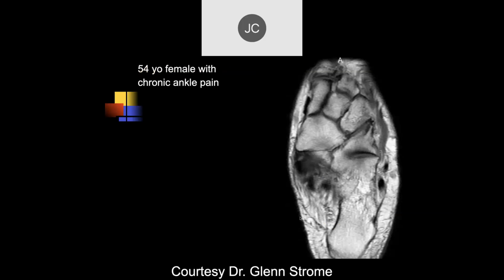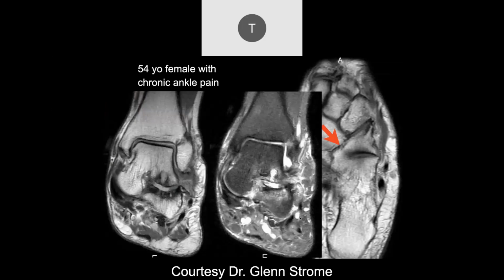All right. So I think the calcaneus has an osseous coalition with the cuboid. Okay, or yeah, cuboid. And then we can see that because of this coalition, there's a lot of abnormal stresses in the ankle joint, and you can see the severe degenerative disease involving the subtalar joint space.